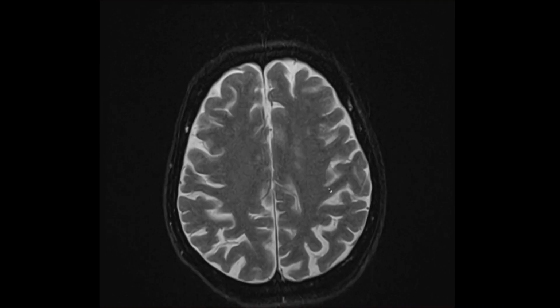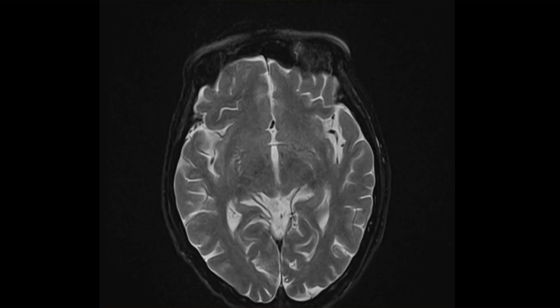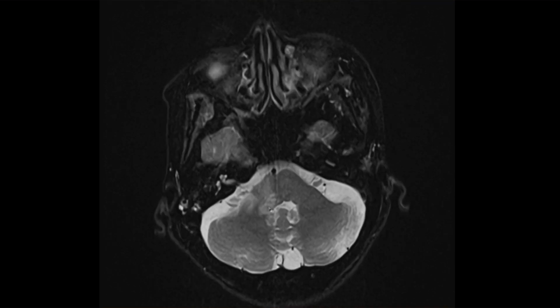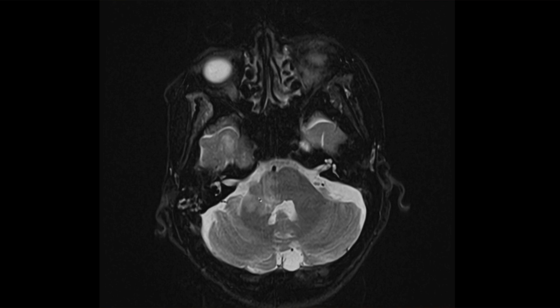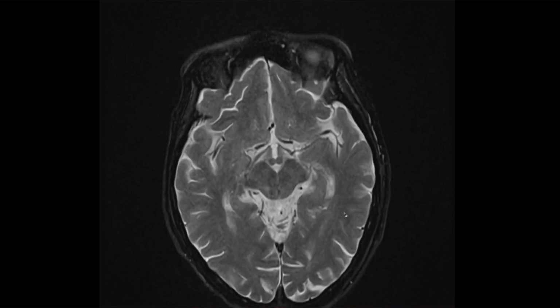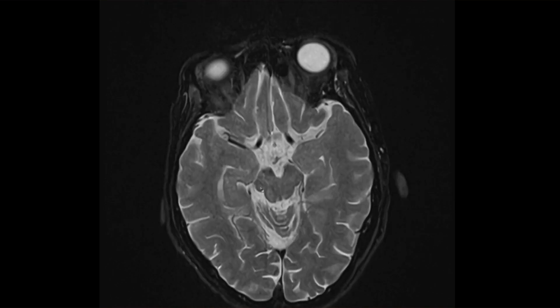The other thing is that the dural venous sinuses, when COVID, people are getting these like venous sinus thrombuses, dural venous sinus thrombus. So this should also be dark up here. And the other thing they're good for is looking at the posterior fossa where the cerebellum is. So sometimes on FLAIR, which is kind of the workhorse T2 sequence, we can't see this area quite as well. There's a lot of artifact because there's like air right here and a lot of fluid around this area. So for the spinal cord and posterior fossa, sometimes the T2 sequence is better to look at this.